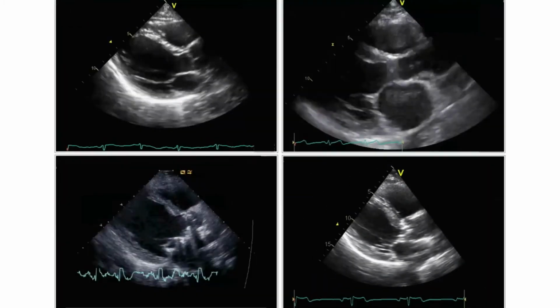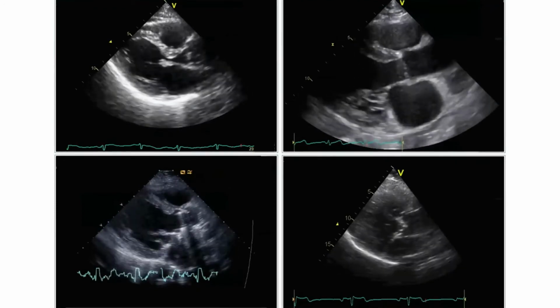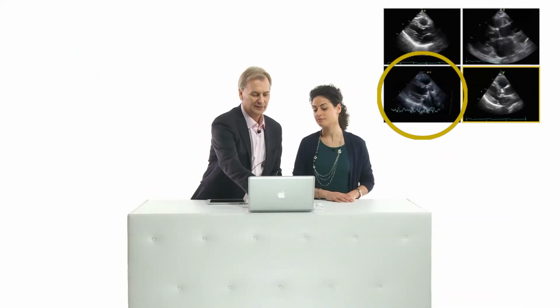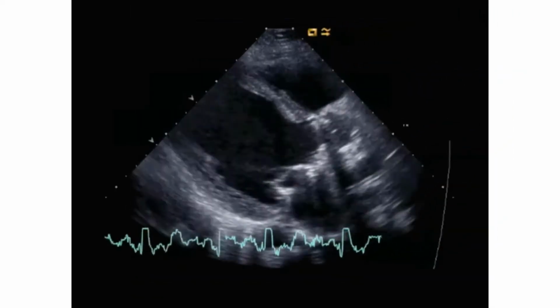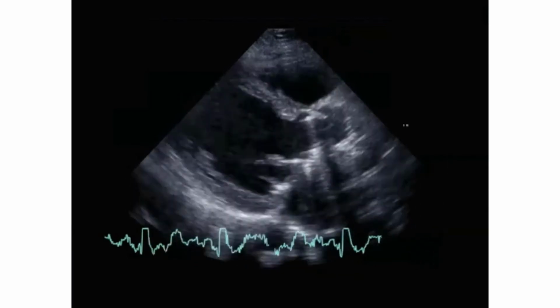Of course, the valve which was stenotic is the last one. But Anna, couldn't it also have been the one here? This one, doesn't that also look like an aortic stenosis? I mean, there's a lot of echoes there. It looks calcified. Yes, Thomas, but actually what you are seeing is something else. They are prostheses and rings. We will talk about them later on in our course, so don't worry for now.